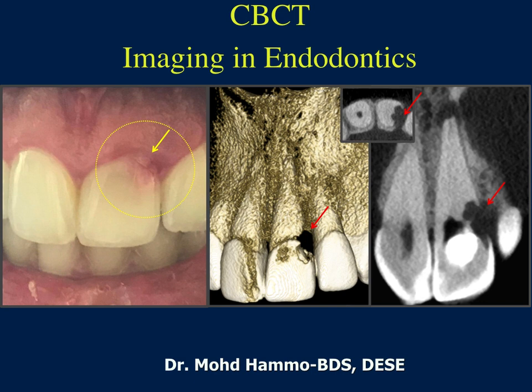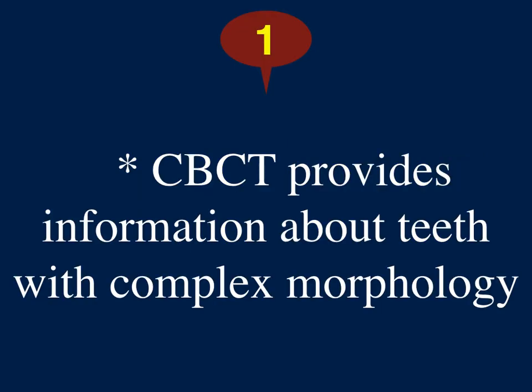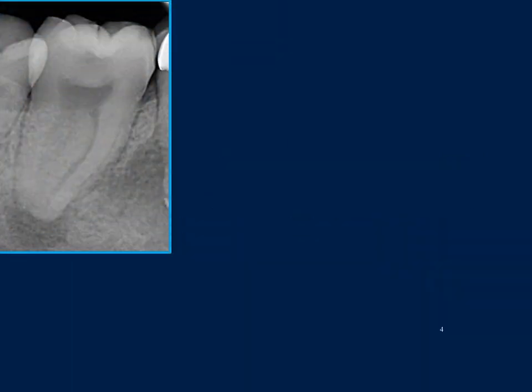My subject today will be about the CBCT imaging in endodontics, and during this presentation, I will show you 14 causes to use CBCT in endodontics. The first cause we use CBCT, it will provide information about teeth with complex morphology. You can look at this case here where we need more information about such anatomy.